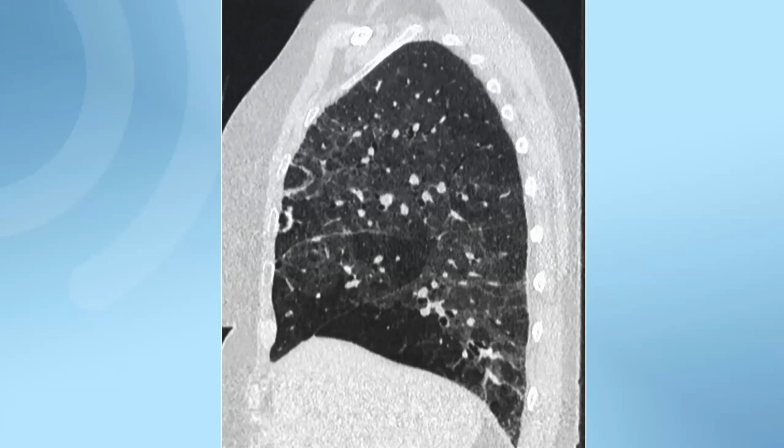Let me see. Okay, some of you are now here in favor of reticular abnormalities. If you see these lines here, some might say that this is reticular. However, this is not representative. Whenever we ask for the pattern, we go for the predominant pattern. We need to describe this. I wouldn't describe this as a reticulation. I would describe this as band-like consolidation and not as reticulation.